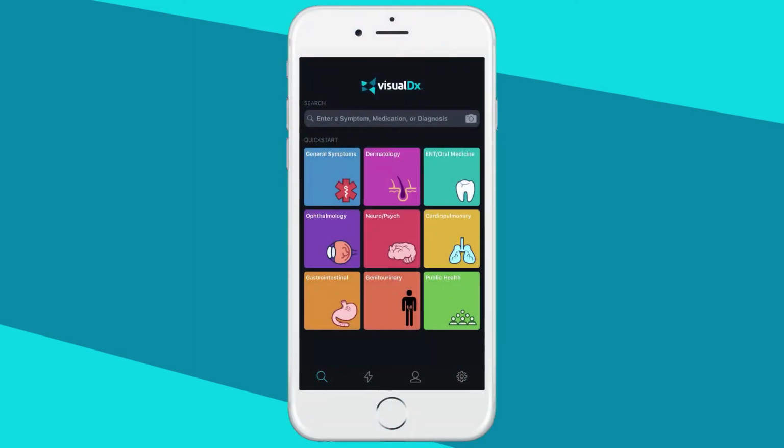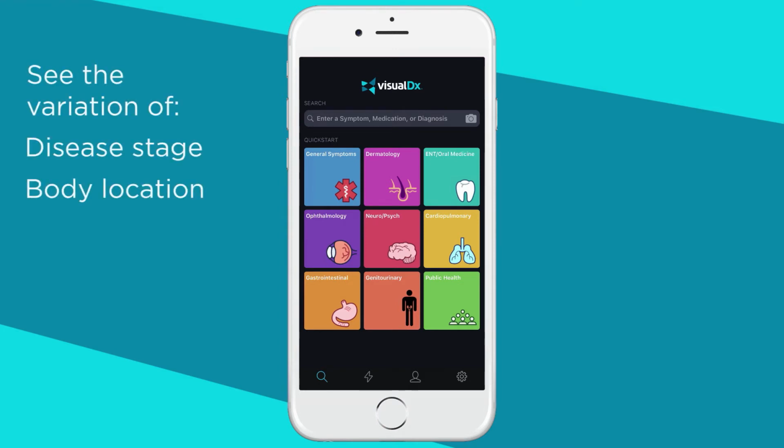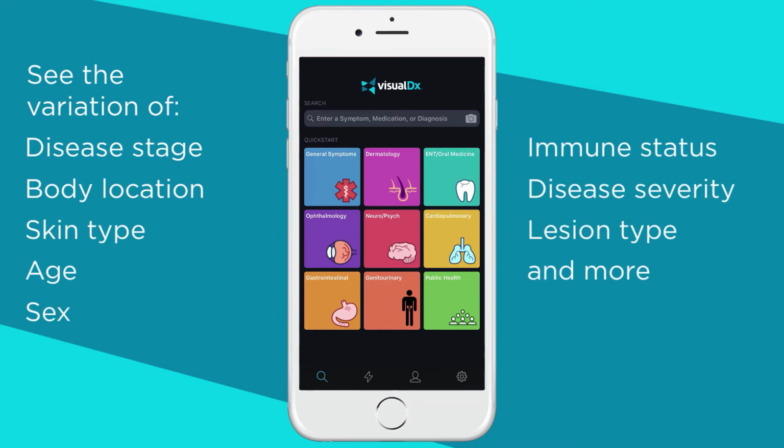VisualDx has tens of thousands of medical images vetted by our medical image team that cover various disease stages, body locations, skin color, and more. You can filter your images to quickly narrow your search to find the image that best matches your patient's presentation.